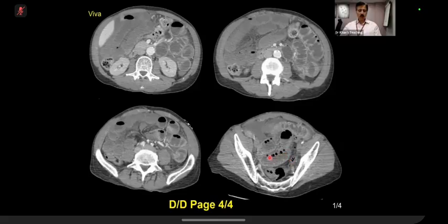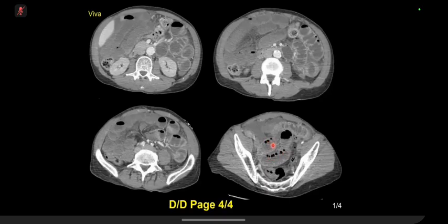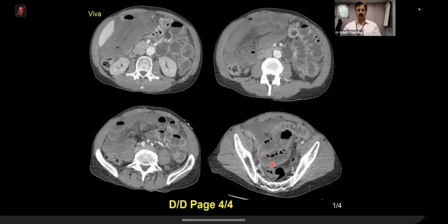You see, this is what we call small bowel string of pearl sign or string of bead sign. And this sign means that there is bowel obstruction. Anything else? There's locules of gas within the pelvis, sort of inferior. Else? No, I'm not interested. That is intraluminal in the large bowel. Okay, the bowels also become featureless. There's a lot of fat stranding.